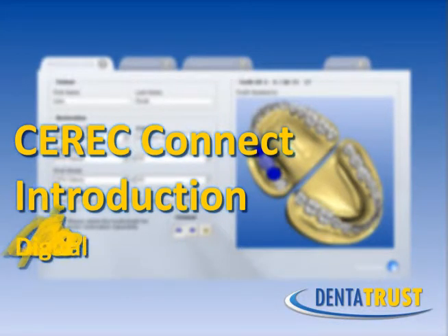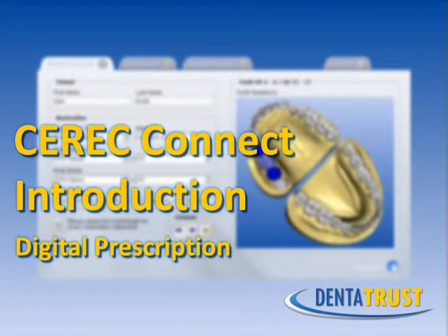Welcome to the CEREC Connect introductory video. During this video, you will learn how to send the case to the lab of your choosing.